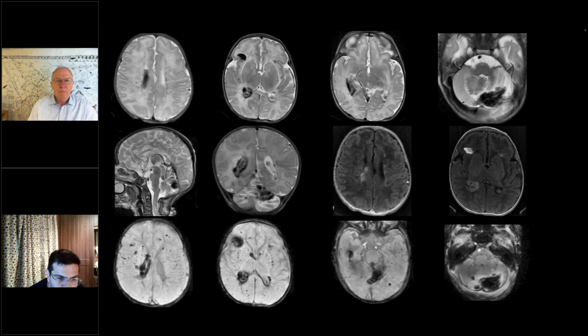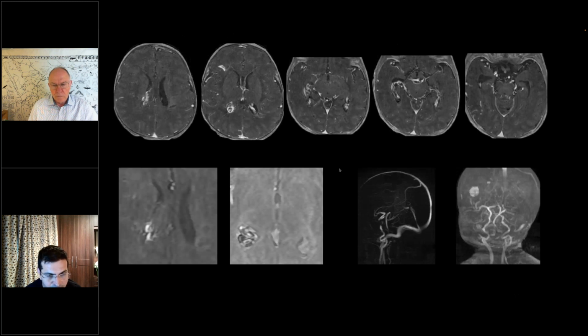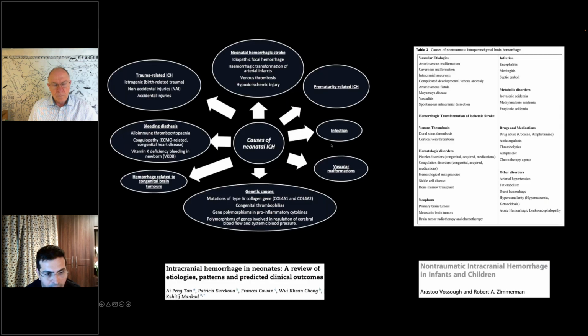I don't think there is an AVM in the choroid plexus. We don't get AVMs outside the context of a vein of Galen aneurysmal malformation in this age, in this population. And that is the choroid plexus hemorrhage, what you're seeing there. This is the commonest driver apart from coagulopathies. And then you kind of go down the list of the rare things, but common things being common.